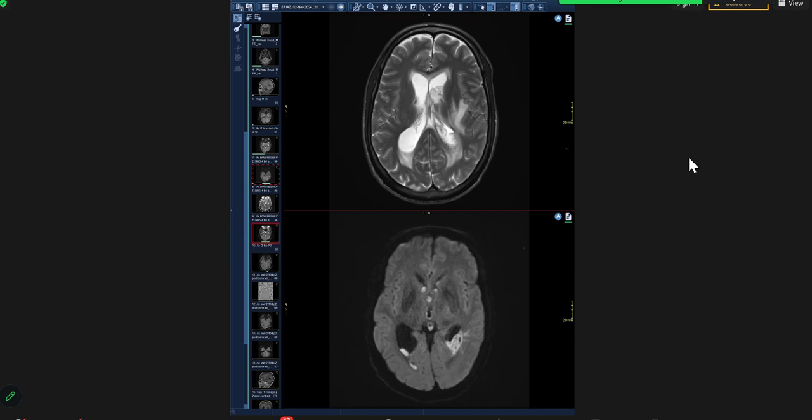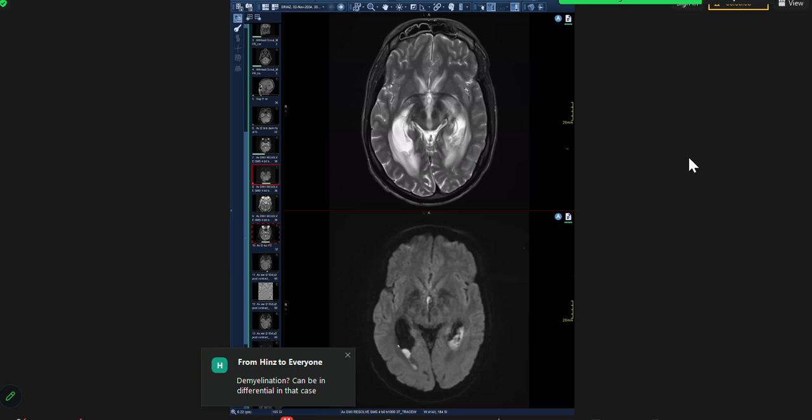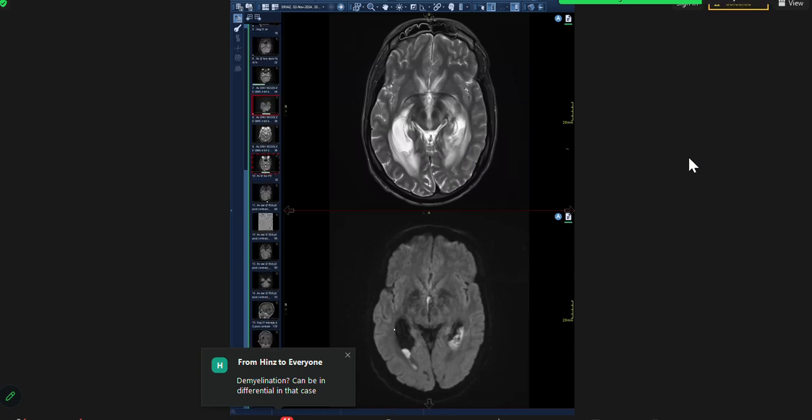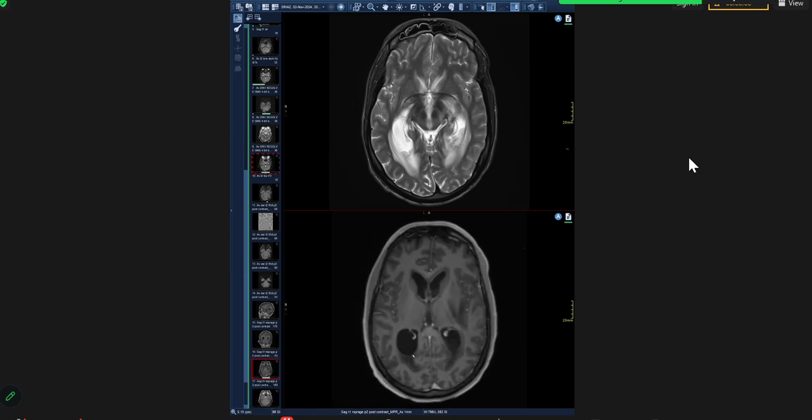Ependyma is the lining of the ventricle. And ventriculitis, I guess, means all of the ventricle. So when the ventricles enlarge like this, that would be ventriculitis because of all this inflammation going on. And when the lining of the ventricle enhances like this inside lining in the post-contrast image, then that would be ependymitis, the lining of the ventricle. If this enhances, that would be ependymitis.